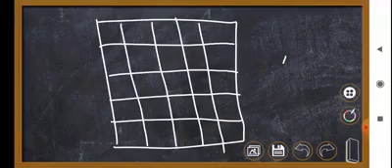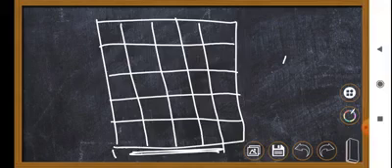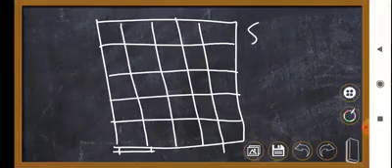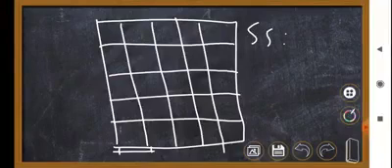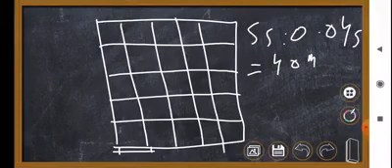First, coming to the horizontal plane or the units of time, every small scale like this is equal to 0.04 seconds, or in other words 40 milliseconds.